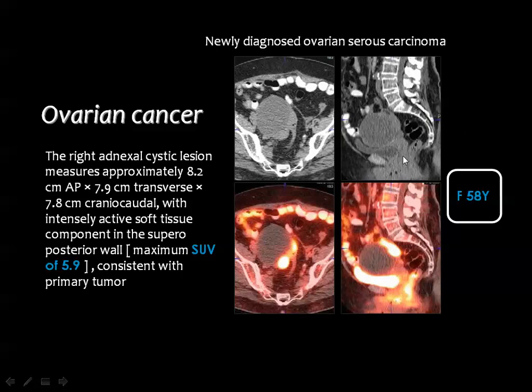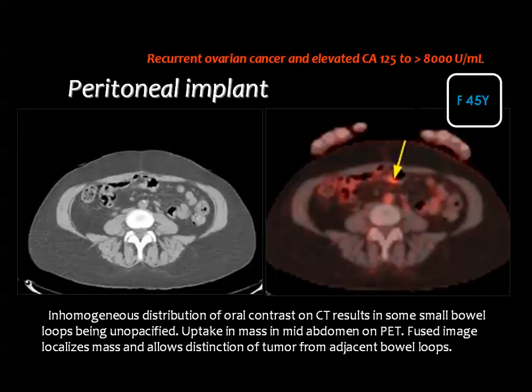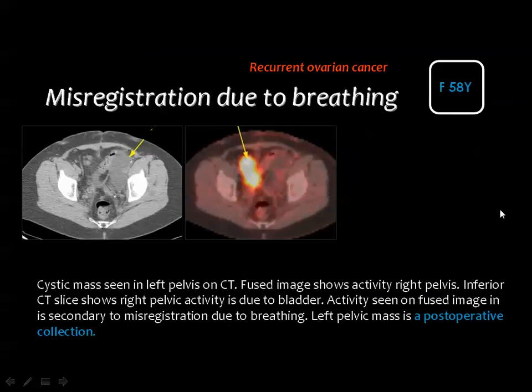And then you can easily diagnose the primary tumor in the ovary by ultrasound, by CT, and by MRI, and this is not the major role for PET-CT. But what is very important is the diagnosis of spread, especially in the peritoneum. And these images are seen here, where you can see the difference between PET-CT for detection of very small peritoneal implants, and the failure, as these implants cannot be seen on the regular CT images.